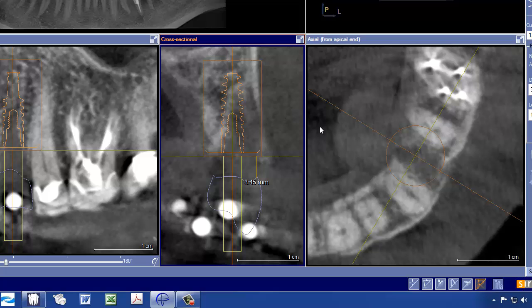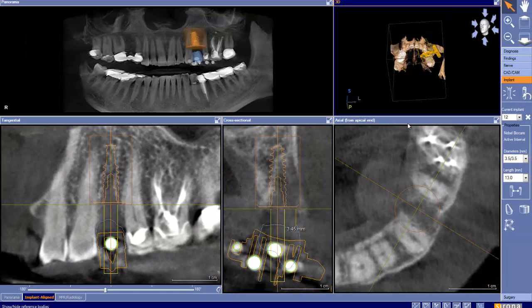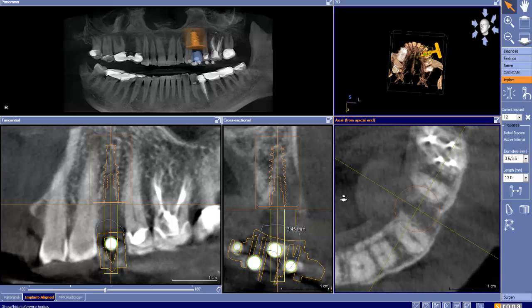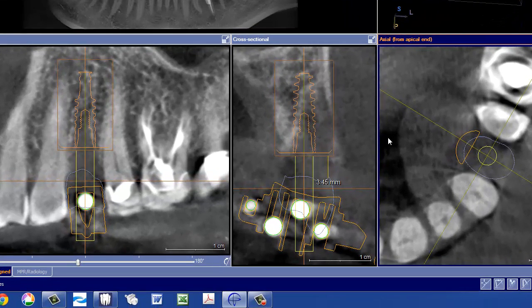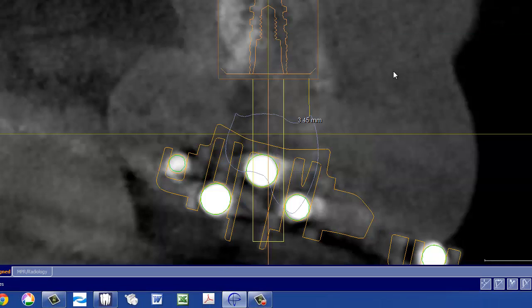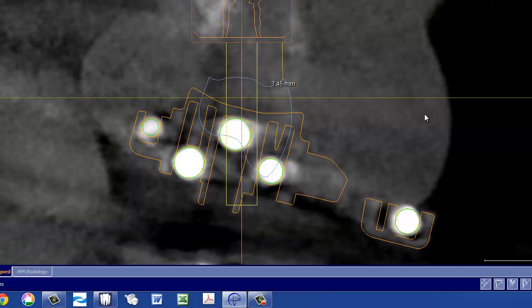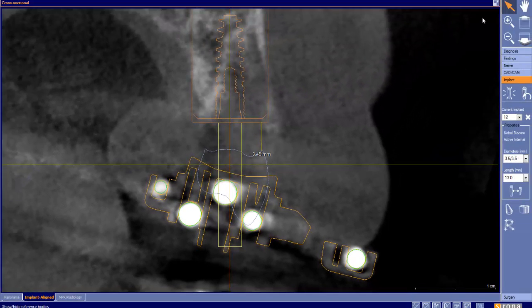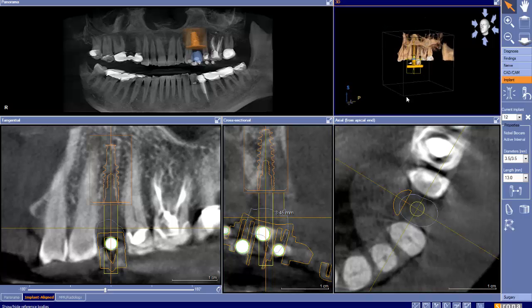So now let's go back and focus on what it is that we talked about. So let's focus on the CEREC guide part. Okay, so now the question is how do we set the D2 value on this? So one thing I want to point out here is the angulation of the X-ray aid. Again, it is nicely placed. If we take a look at it again right here, you can see that.